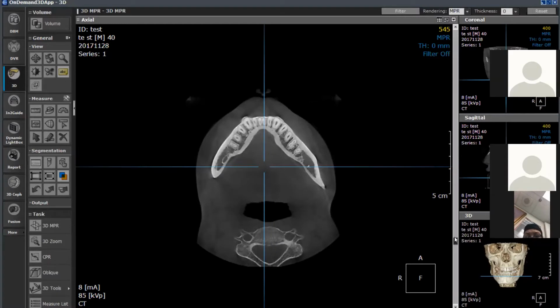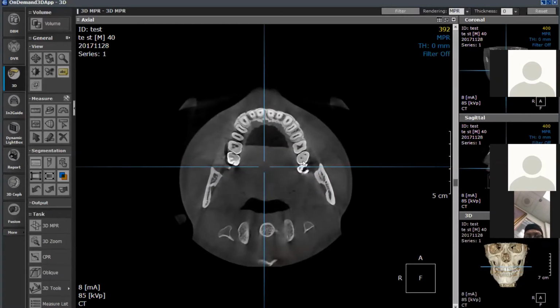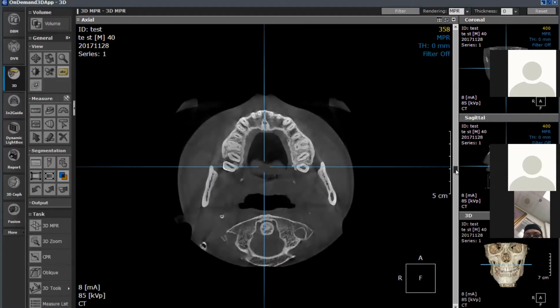If you go up to the maxilla, which I'll move up this way, again, same thing, we're going to be able to evaluate the teeth themselves and move our way down through. We can actually see in this case that this one splits into 1, 2, 3, 4 roots. Again, that gives you the ability to predict what you're going to get into before you get into it. Moving on, I'll bring this back to our original screen here.